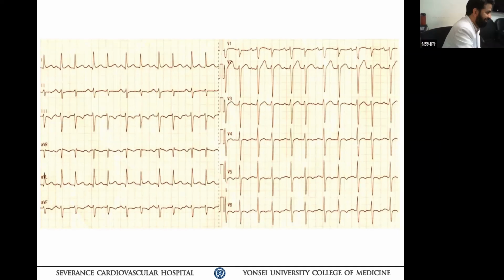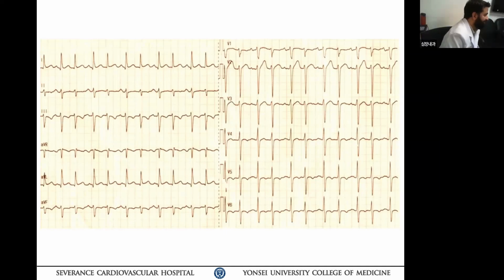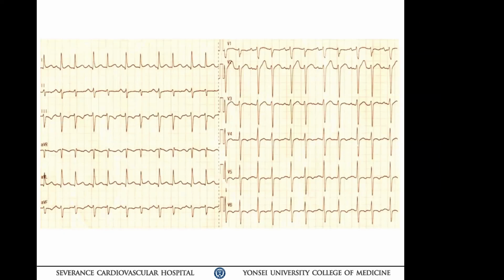Oh my God. The idea of 1 to 2 is out of the window here, okay? Secondly, Dr. Yu said a 1 to 2 window that long? I don't think so. So I think we have to explain why the QRS morphology changes and becomes narrow, and all this needs to be explained.